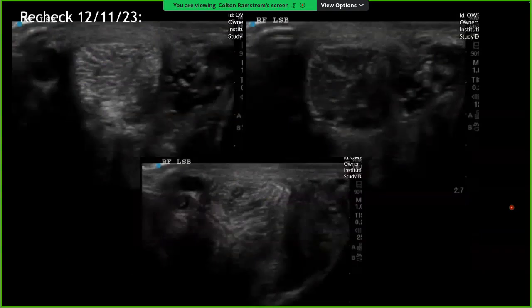This is the recheck ultrasound. So these top images here, those are right about that level where we saw that kind of distinct fissure line coming through here and here, almost taking a wedge of that suspensory branch out. And you can see that we can still see some remnant of that on the negative image at that same level. We can see that some of those fissure lines have filled in with a little bit of fibrous tissue. So pretty happy with the healing there.